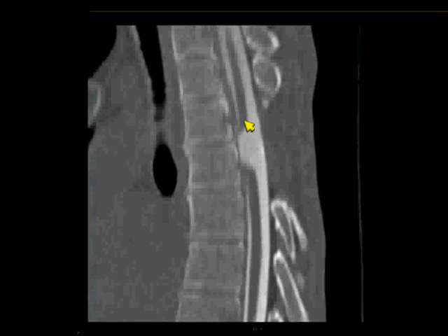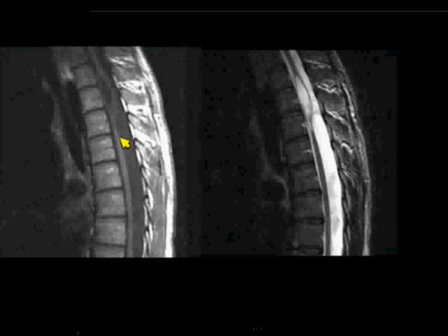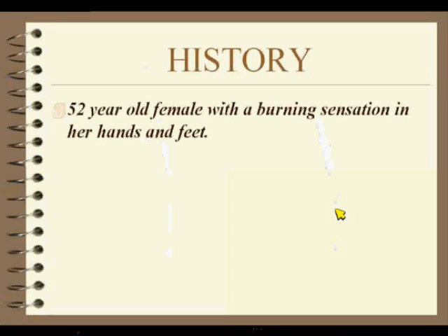And they can look quite ominous on the CT. Big divot here. Cord looks like it's gone away, almost transected, but it's really just in that rent. Here's an arachnoid cyst. It shows you the difference, a little bit smoother transition. There's the flap of the arachnoid cyst, and here's an incidental or not so incidental syrinx up above that level, and you see a little bit of the dephasing in the arachnoid cyst.